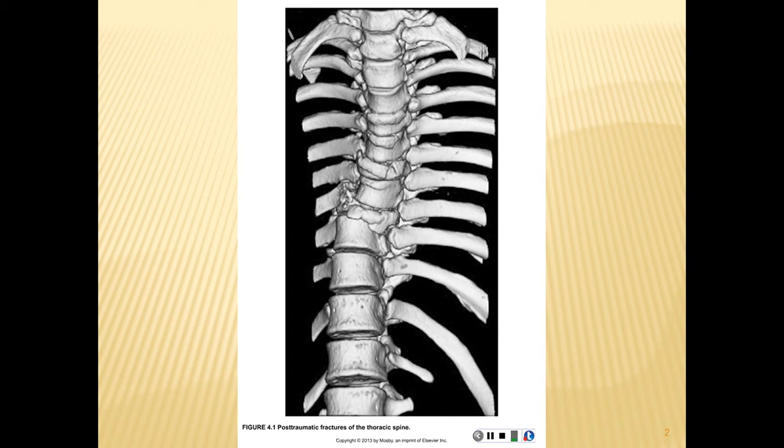That's not totally uncommon. However, the fracture involved a piece of the transverse process lodged inside of the spinal canal, abutting the spinal cord. This individual was extremely lucky to have not lost lower extremity function secondary to this type of injury.